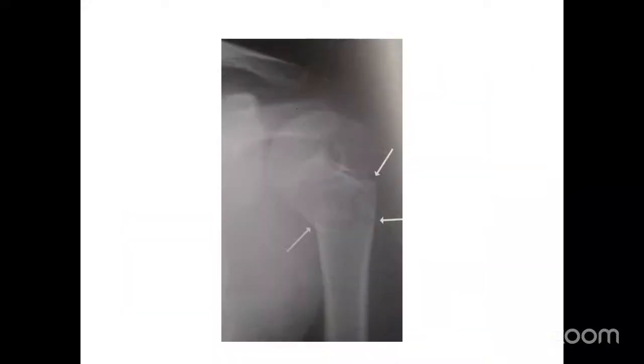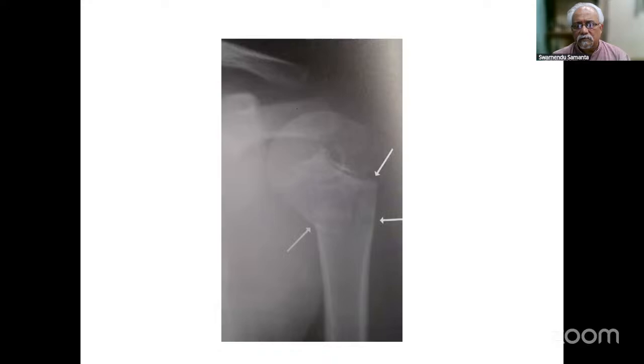So this is another pediatric X-ray. Can anybody just tell me in short? Now probably we are on the proper way of how to present the radiograph. Anybody, somebody. Rupam, you can join again.